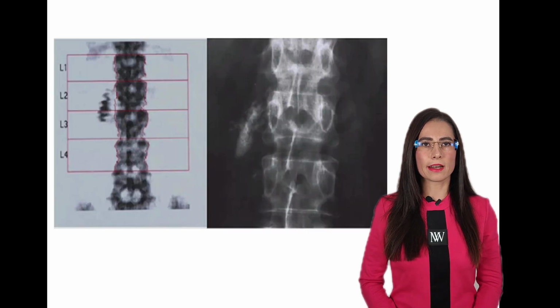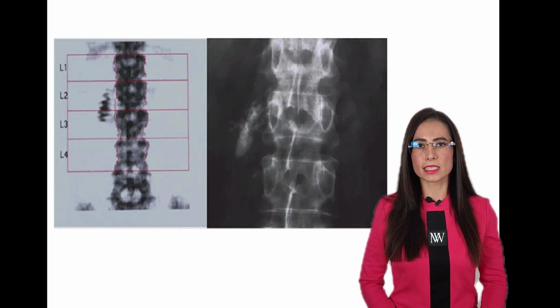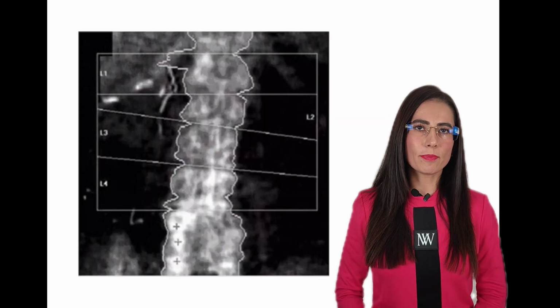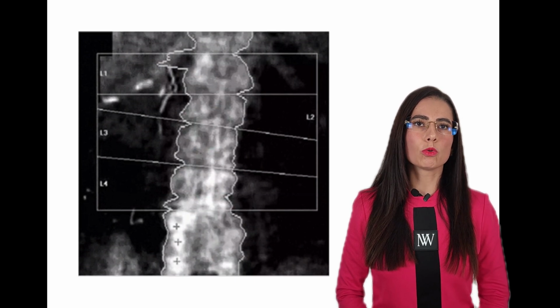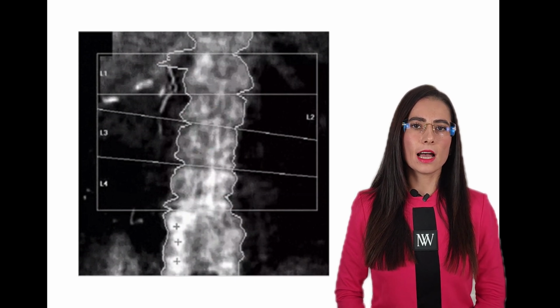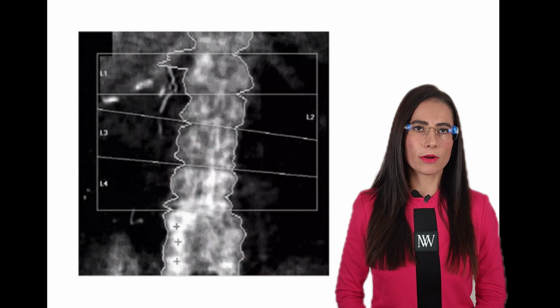Soft tissue mineralization in calcifying chronic pancreatitis may result in falsely elevated bone density despite the lack of overlap with the lumbar vertebrae. Fractures of the spine lead to asymmetry and subsequently to calcification and to the formation of spondylophytes, which can significantly increase the bone density of the corresponding vertebra.